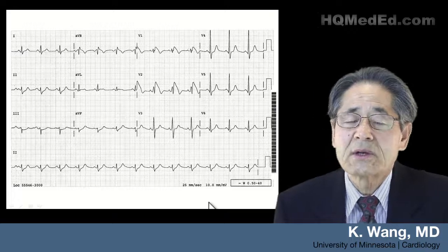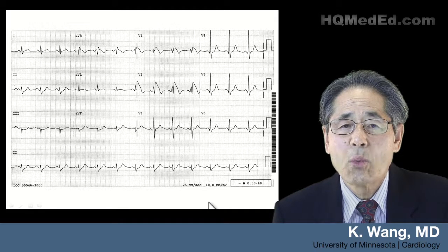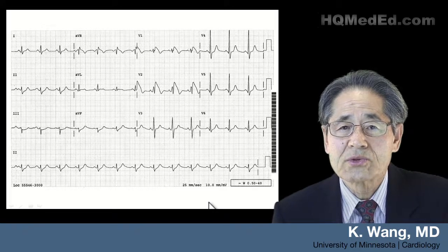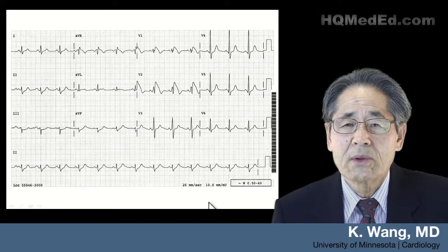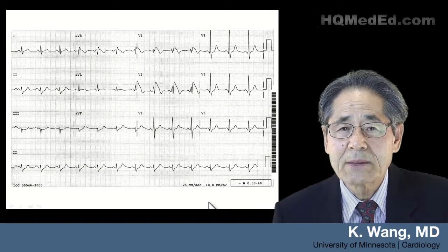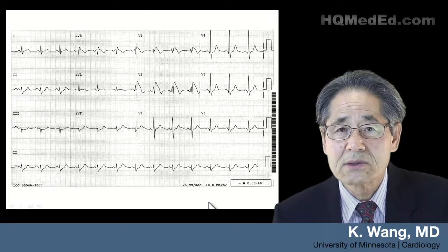That's a congenitally defective sodium channel causing ST elevation limited to V1 and 2 mostly, and they are prone to sudden death, especially when they are sleeping. Hyperkalemia also can disable the sodium channel. Then during that period, you can have an acquired Brugada ECG pattern like this.